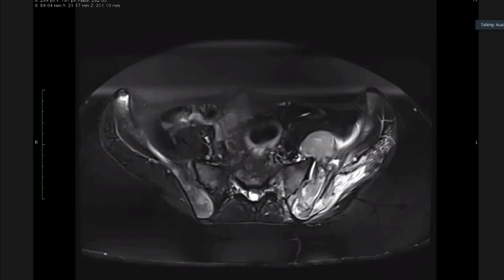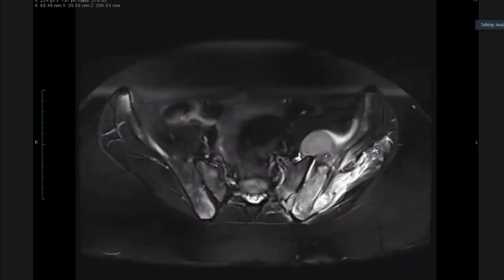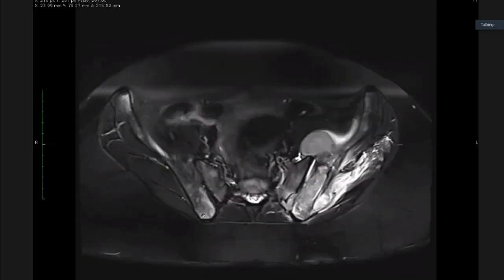But what is this lobular abnormality next to the joint? What's the term you use to describe this? Geode. Sorry? So it can be a geode? A geode is in the bone. A geode is like a subchondral cyst. Sir, you said that next to the joint, so I immediately jumped. Yeah. So it is next to the joint. Yes, sir.